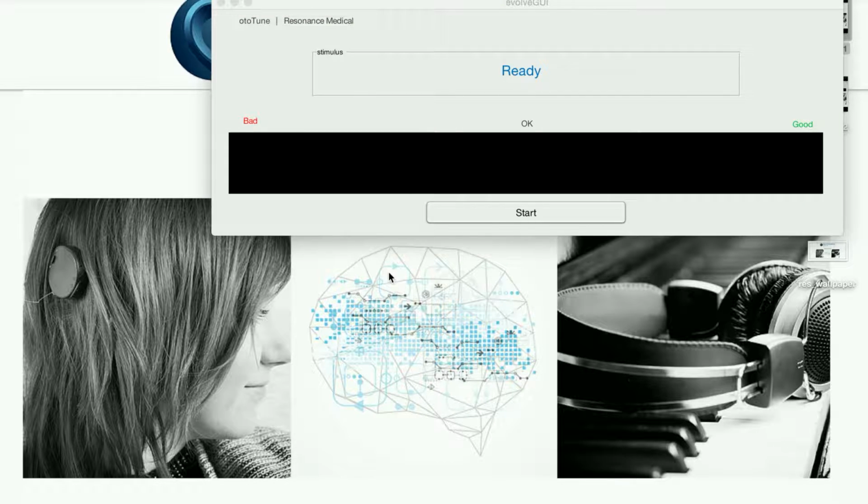Our next approach involves something called an interactive genetic algorithm. The way it works is that the subject will hear a word played in, let's say, 5 to 10 different ways, or with 5 to 10 different sets of parameters. About half of these parameters will be similar to the original settings of the cochlear implant patient. They'll be drawn stochastically, but around those original settings. The other half will be drawn totally at random. Then the subject will hear these words, and they're going to rate them on how bad or good they thought they sounded. Let's just see how this works.